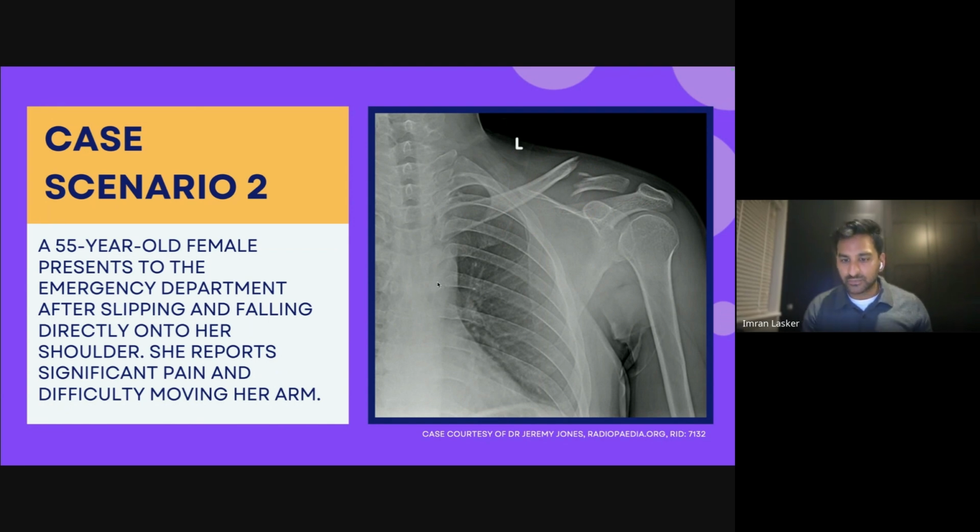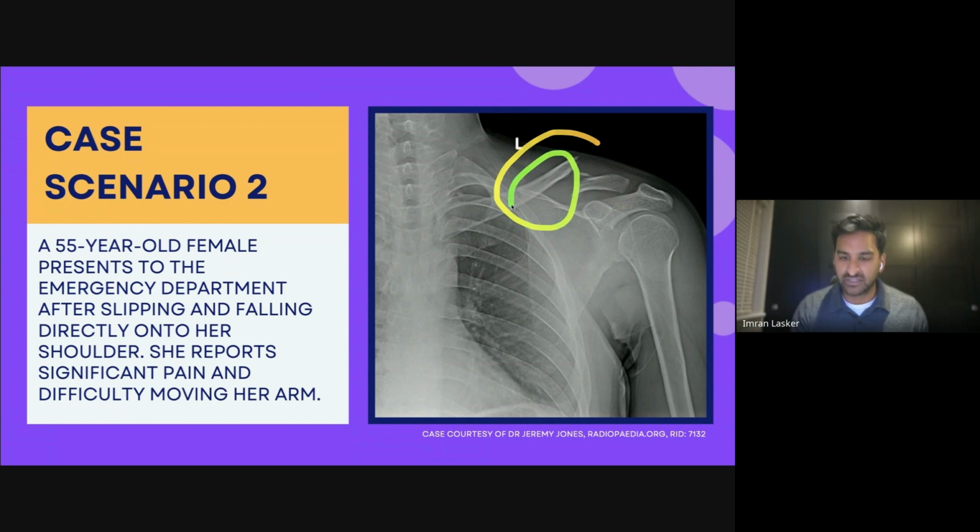So it's a distal third. I would say it's probably going to be a middle third, because that's nomenclature at the end of the day, but I would normally split it like this, like that. You can say distal third, but usually when you say distal third, radiologists and most people think, oh my God, what's happened here? When you say middle third, you kind of say, yeah, around there.